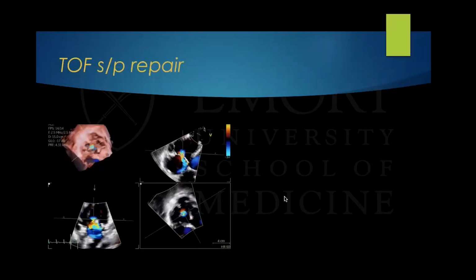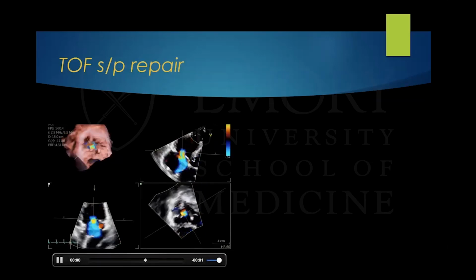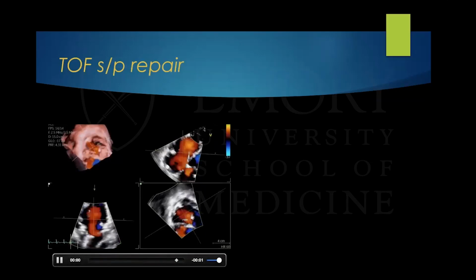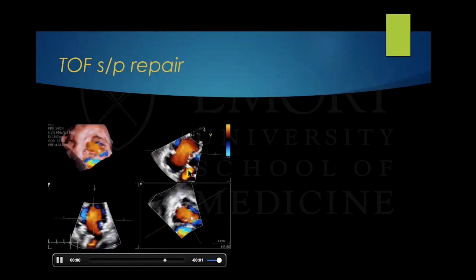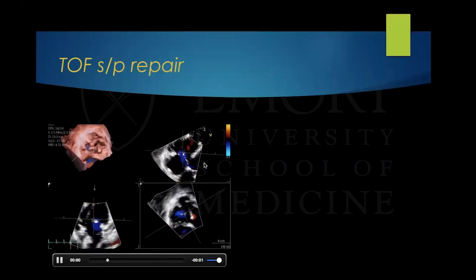The tricuspid valve sometimes can be leaking, and this is because the septal leaflet that is near the VSD can be damaged and compromised during the ventricular septal repair. So it's important that we also address the tricuspid regurgitation to see if it needs to be repaired at the time of the pulmonary valve replacement.